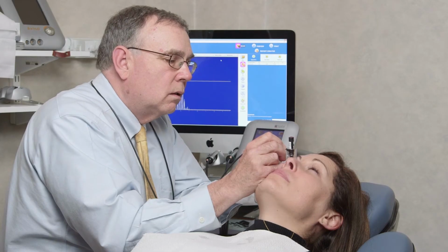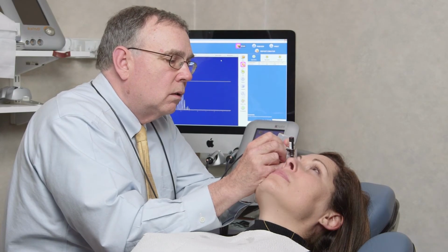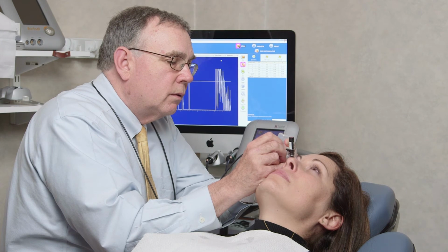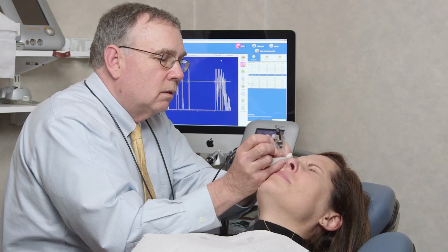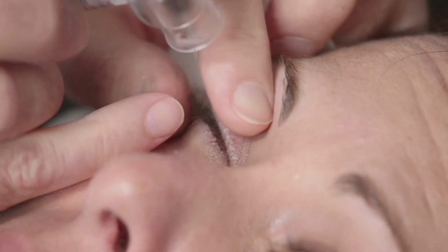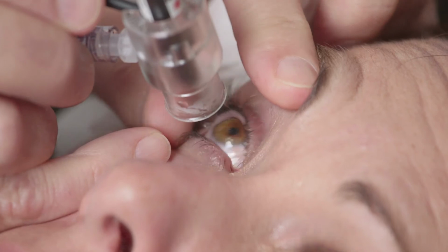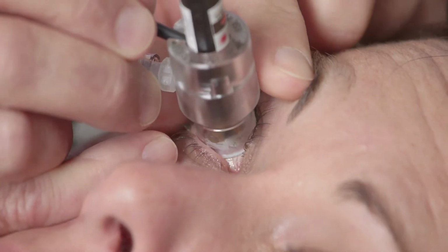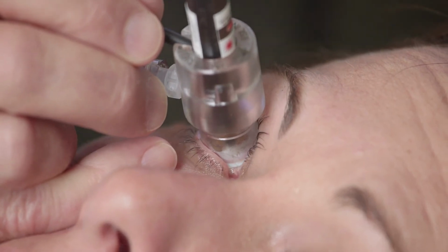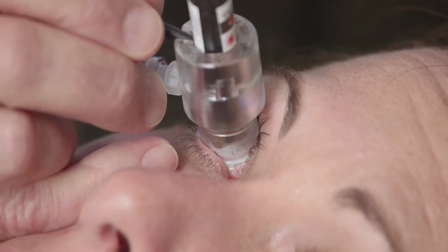Scleral shells come in different sizes that correspond with a range of corneal diameters. The Prager shell, seen here, is only one of many brands of scleral shells. This particular shell comes in one size only. The Prager shell is fitted with single-use disposable tubing for infusion of fluid from the side via a plunger. The shell itself must be disinfected between patients, and the tubing discarded and replaced.